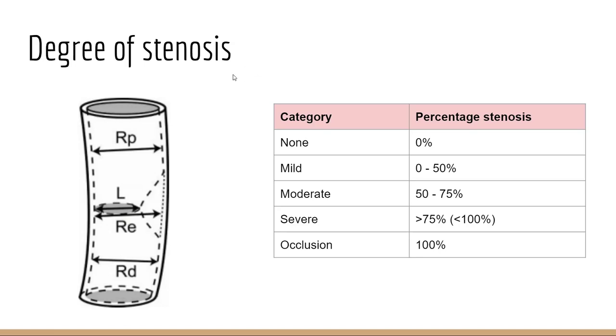So that's what I use. And in terms of where to measure the level of stenoses, this can cause some confusion. An example would be carotid artery stenosis at the carotid bulb. The Europeans like to go at the level of the lesion, whereas the North Americans, we like to find the normal adjacent vessel and make a ratio based on those measurements.